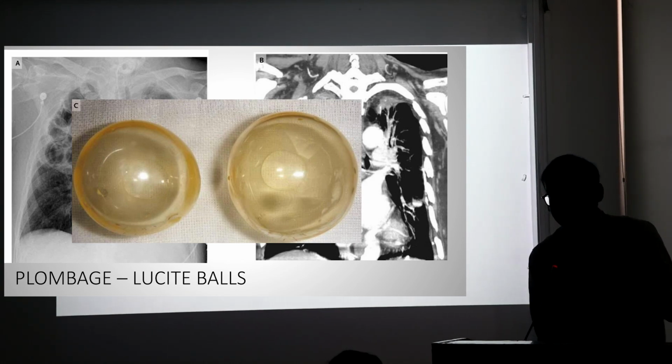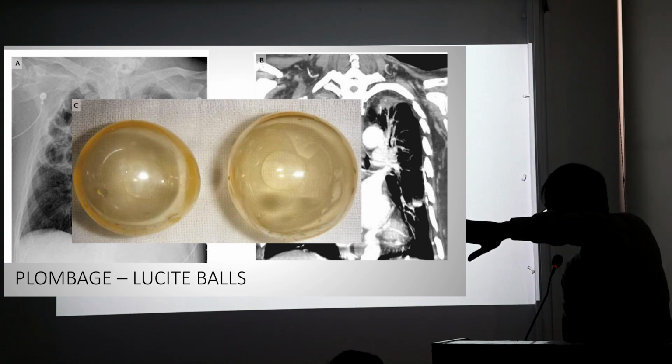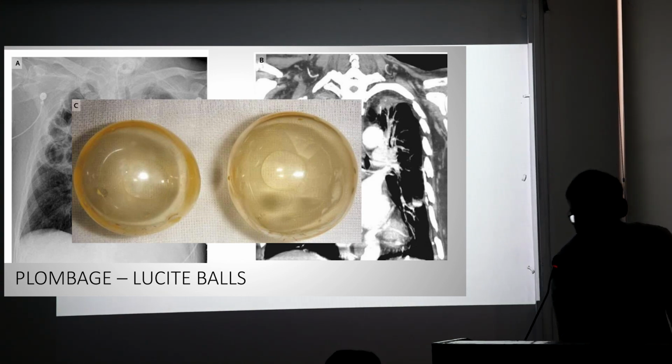So this is a very classical X-ray, nothing related to ICU. This is a very historical picture. I have put it just for interest's sake. Does anyone know what this is? I am talking about pre-1940s or 1950s, I guess. The type of treatment for TB. Yeah, please let them speak.